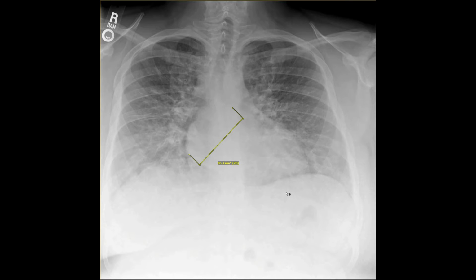Now, why am I showing you another heart failure case? Am I just running out of things to teach you? Well, not really. This is a more extensive version of heart failure. The last person didn't have alveolar edema, which this patient does. So what would alveolar edema look like? Well, look at all this haziness in the lungs. Normally the lungs are very black looking on a chest x-ray. So this is all pulmonary edema spilling out into the air spaces in the lungs, okay?